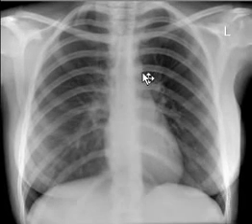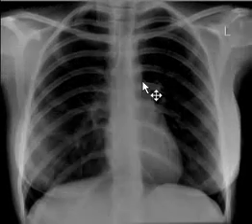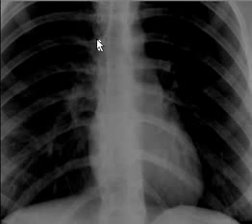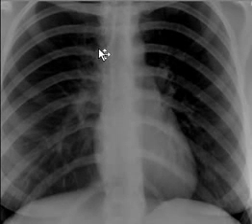Aortopulmonary window is clearly visible as well, and azygos vein. This is azygos vein. Let me show it to you once again. So this is azygos vein, which lies at the tracheobronchial angle, and that's how it should be.